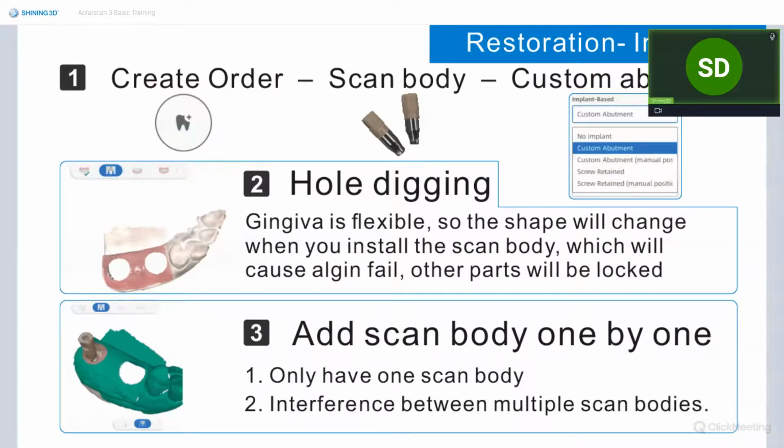How do you turn the scan sound on when scanning? The scanning sound is automatically on, that da da da da sound. Do you have a rapid scan function on? Our scanner does not pick up the models as fast as yours does, so we do not have something like rapid scan. What I did is the same as you guys, it's a normal scan.